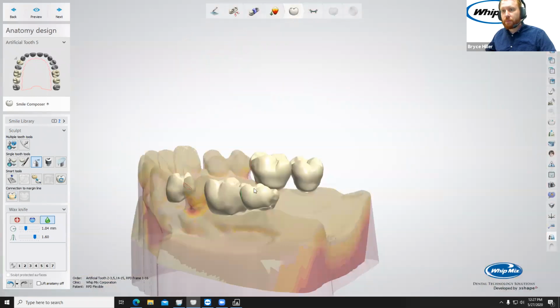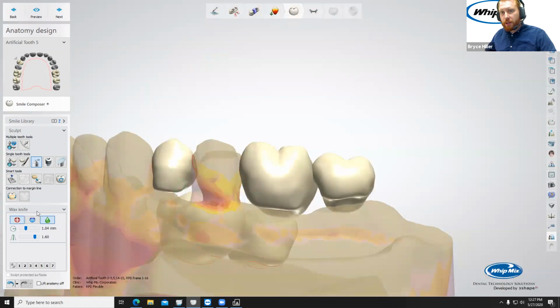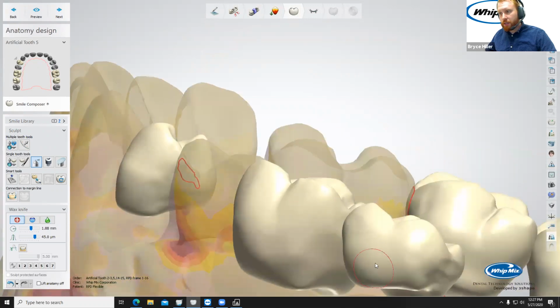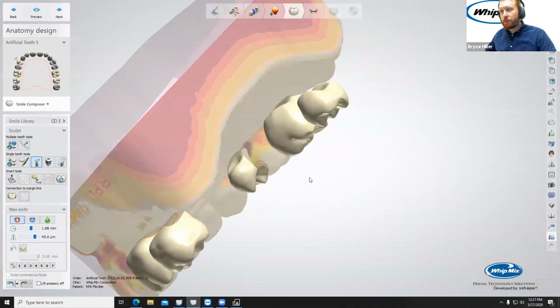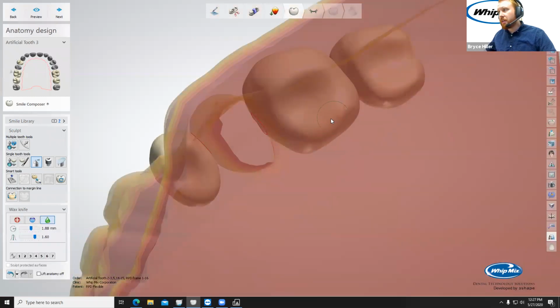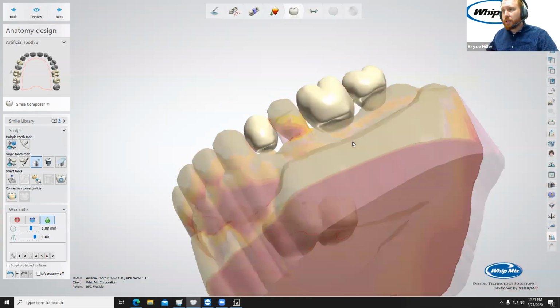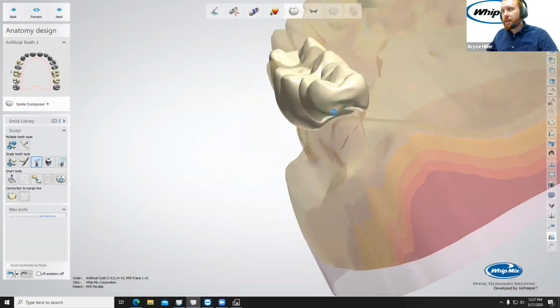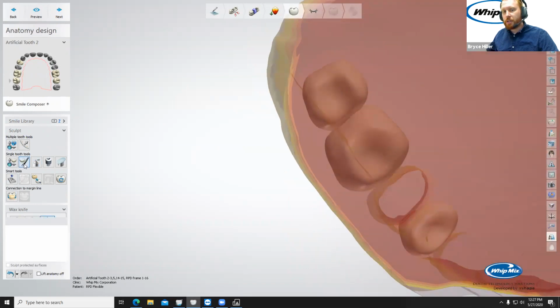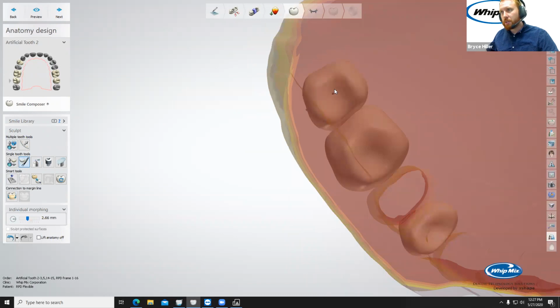So you can see I'm just leaving enough space for a solid tooth pocket. The first few times you do it, you'll probably have to go forward through your partial's design, then see, oh, I didn't leave enough space, and come back and make more space. Fortunately, it saves everything, so if you have to come back and make adjustments, it's going to save your whole partial design. Don't be super worried about that. It's no big deal.